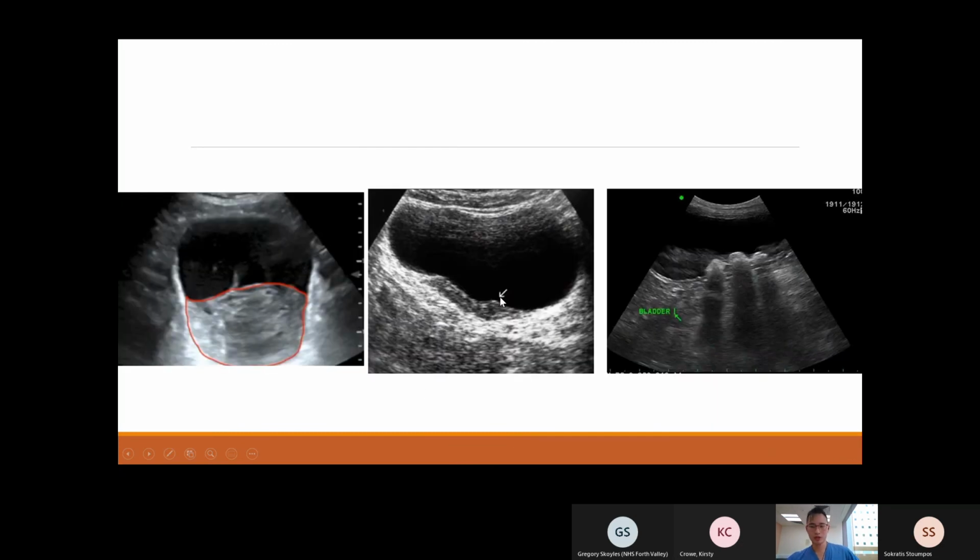So here I've got 3 last images. This is one of my final slides. Does anyone want to give a bash on this one? Who do we still have? Who are the last survivors? Kirsty, do you want to have a go? Or Greg?